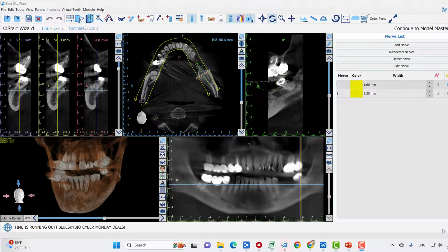Okay, just want to give a general case review, a simple, straightforward case, how we go from implant planning from a crown down perspective to building a surgical guide. So this is the patient's CT scan. Chief complaint is missing of the number 18, 19 teeth on the lower left side. Just of note, we have here a tipped over molar, so we're going to want to just take a look at this and see what we could do to make the situation better.